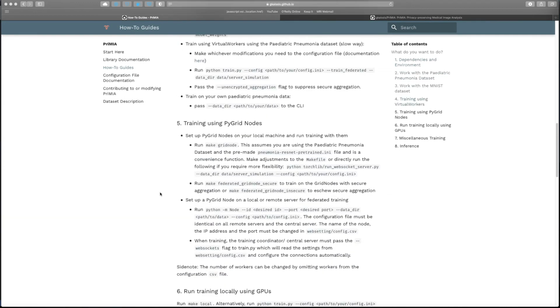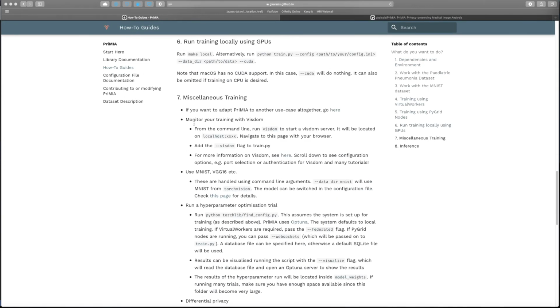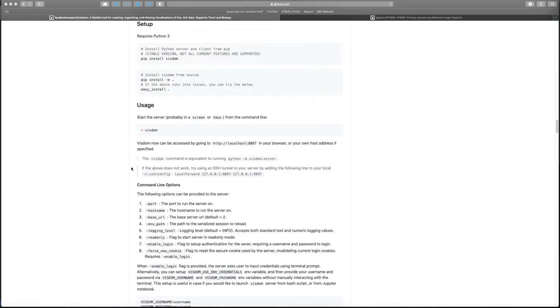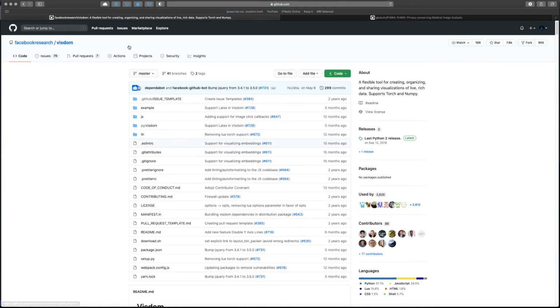That's down here, training with Visdom. And if you also go on the Visdom site, there are a lot of tutorials on Visdom down here. So just click on the link in the documentation, and that'll take you to the Visdom site where you can see how to use it for monitoring training.